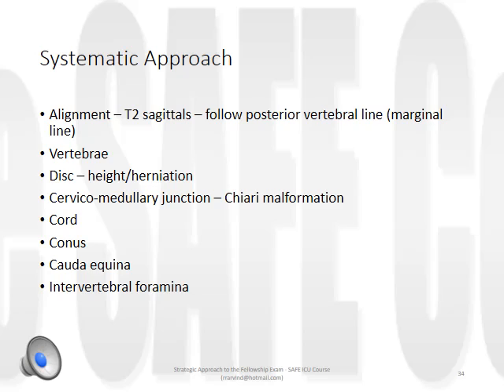And then you're going to look at the intervertebral foramina. Lateral slices on a T1 weighted scan will be most useful here, and you should have patent intervertebral foramen. There's a bright fat pad and a dark nerve root coursing through it. Loss of the white fat signal suggests impingement of that nerve root.